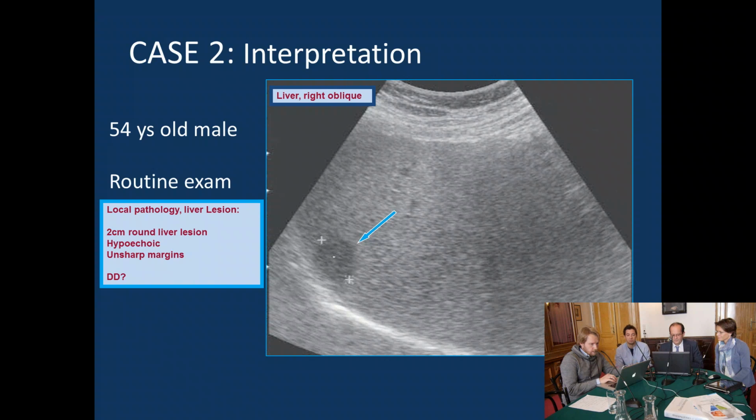Okay. I can tell you straightforwardly, if this would be a cyst, it should have very thick, protein-rich fluid within, because a cyst is usually anechoic, which means black in ultrasound. There's another answer for AV malformation, or inflamed cyst, or again metastases. Okay, metastasis is a good suggestion, which means secondary malignant tumor.